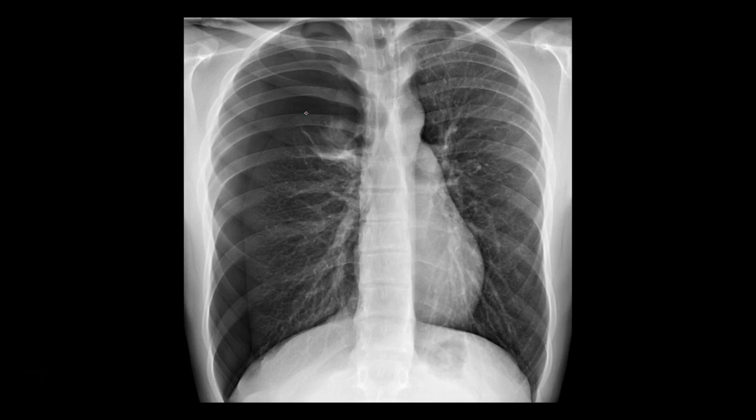This one we can see a fairly obvious lining of the visceral pleura. So you can see all the lung markings up until this level. Now the reason they appear well defined and easier to see compared to the left lung is because this lung has shrunk, and that's the reason the markings have become a lot denser and easier to see.